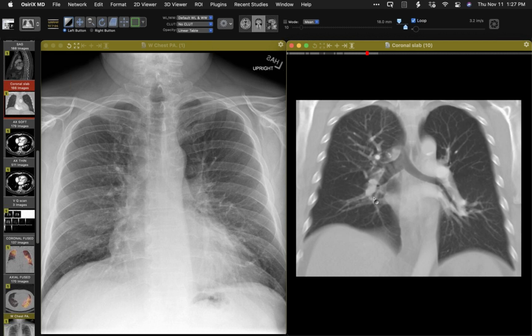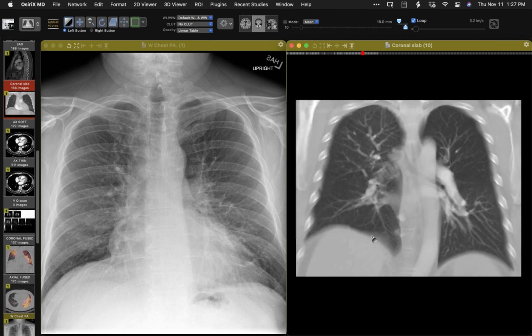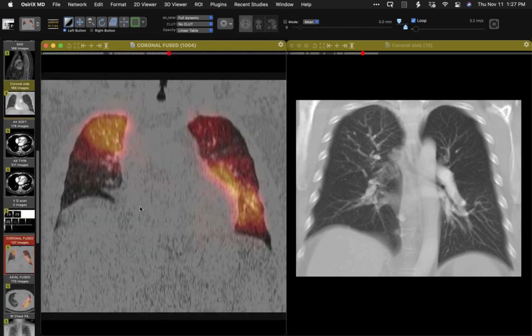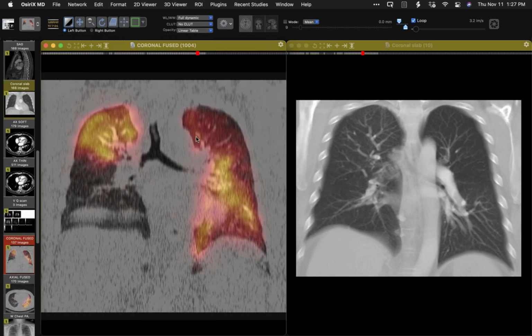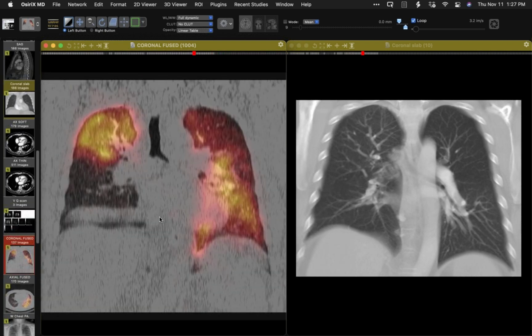So small up here and small down there. If you have a patient with pulmonary hypertension and you see this kind of thing, then think of course, vascular pathology. And here we go. So no surprise, for example. Again, I'm not showing you this in order, but I'll just show you the important parts. That we are going to see that when you do a ventilation perfusion scan and SPECT, no surprise that relatively little goes up here and almost nothing goes down there.